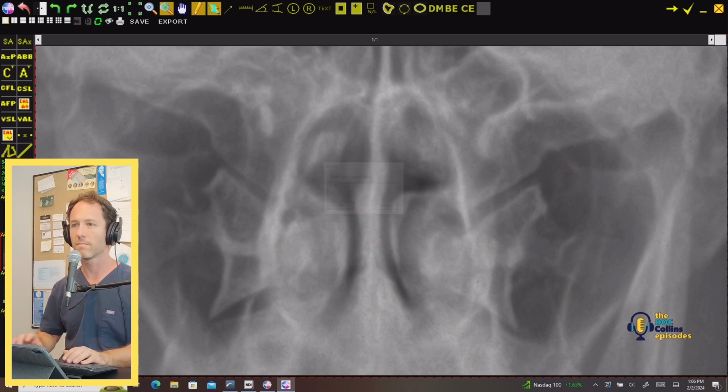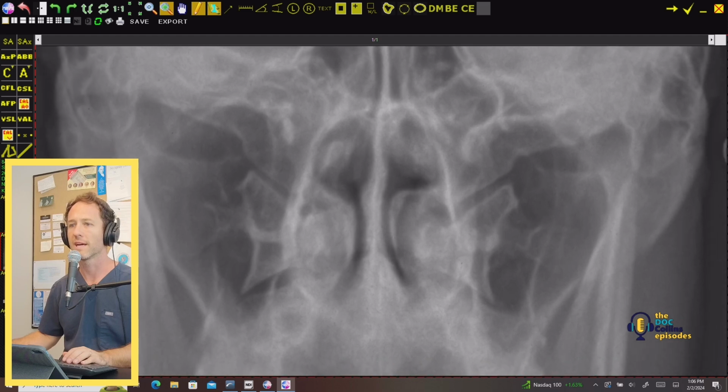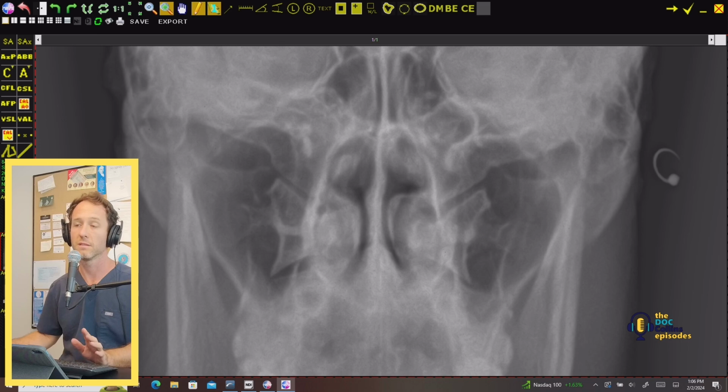And in general, if you have to err on one side or the other, when it comes to the condyles, you would go for the tighter radius, and on an axial surface, you would go for the flatter. That's what I've been told.